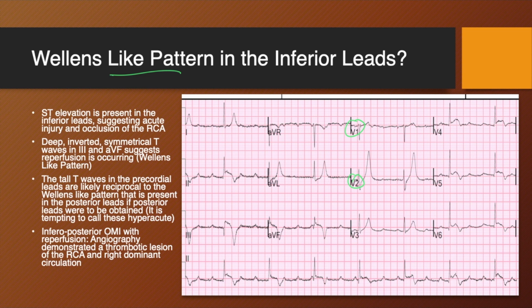So here you have some interesting findings. You have some ST elevation in leads 2, leads 3, and AVF. So you have ST elevation, but you also have these deeply inverted T waves, right? So you actually have a STEMI.